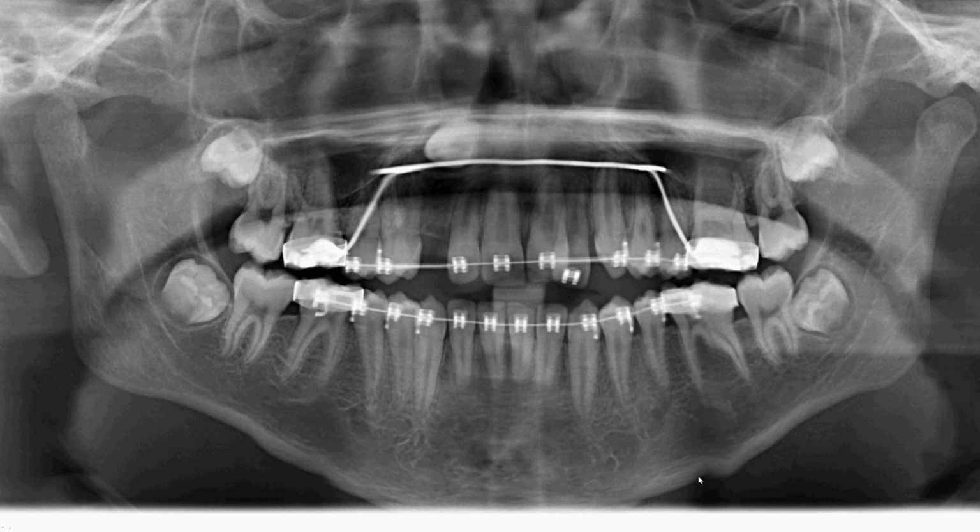Right now, there's a very minor step deformity along the inferior cortex of the mandible. And you can see that this area coincides with this area and then this area, and even though it's not as clear, it probably affects all of this area. So now I've given you a big clue of what this most likely represents.